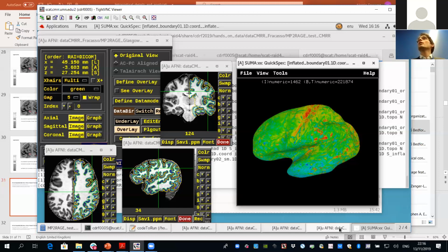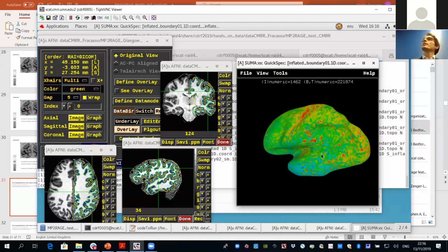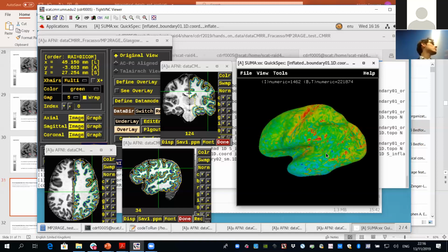I don't use them in a standard way, but it's a very flexible platform. So I bend it the way I want it. So this is what I mean. Here we can see live. There's not that much of an acceleration, but if you have a nice GPU, you can accelerate it and you can move it very, very quickly.